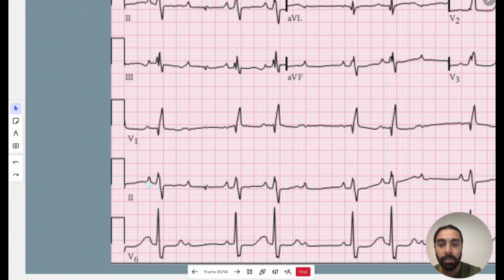So we see a positive P wave in lead 2, that's good. You see the slurred QRS, so there may be a prolonged QRS, and there's a P wave, QRS. This kind of looks like the same P wave, so it's hard for me to tell which one's a T wave. If I go vertical, I can see that that's a T wave, just barely noticeable on the P wave. It doesn't mean that it's not there. So P wave, QRST, P wave, and then no QRS, even though there's a little blip here. There's no QRS anywhere else vertically. So it's a lone P wave here.